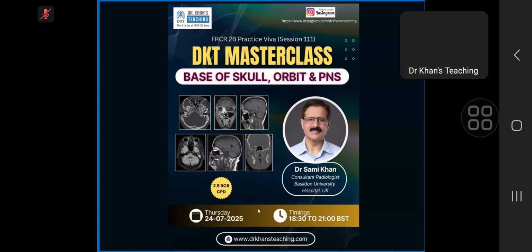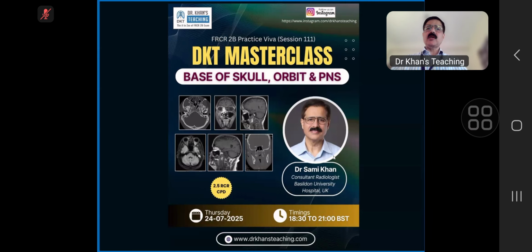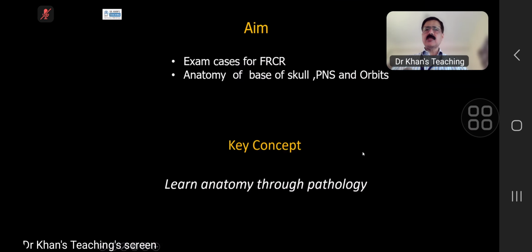Okay. So, today is going to be a special session, and this is, of course, base of skull and portion of paranasal sinuses, orbits. My main emphasis will be on base of skull. In this session, I have selected 10 cases, and the aim is to learn anatomy through pathology.